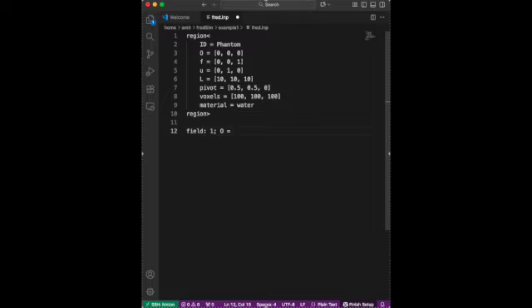In this simulation we have to define the field box from which the beam will emerge, because in that matrix, the field box, we have to define the initial divergence or convergence, how the protons will spread when it comes out. I mean the beam, not protons only. Yeah, of course the protons, how the protons will spread, the divergence, the radius of the protons.